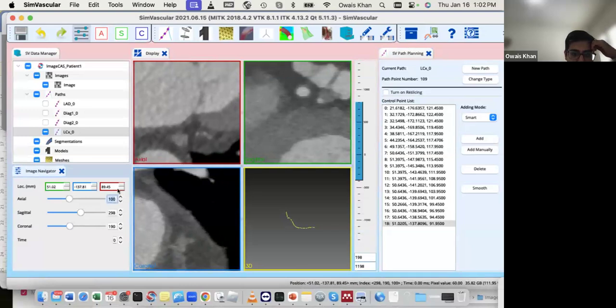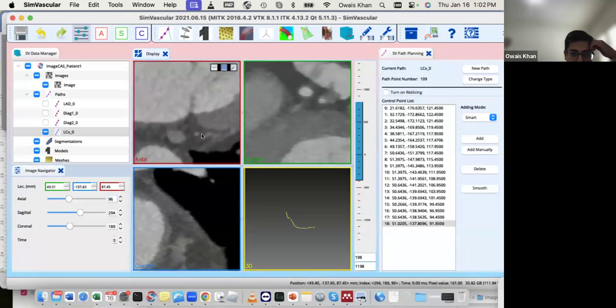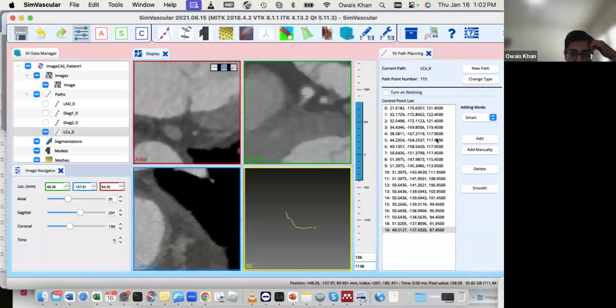Now it's branching out into what, I don't know, more branches. I can track the main branch still.